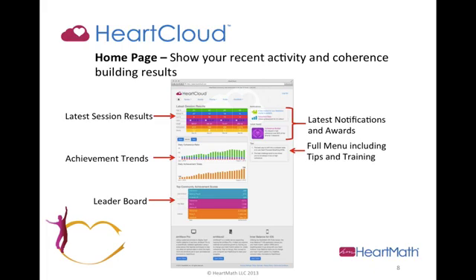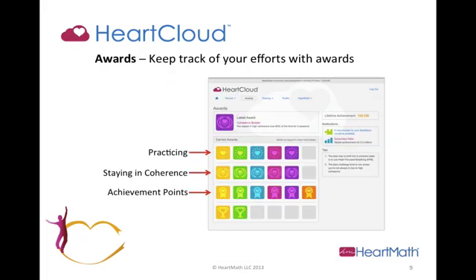On the Heart Cloud homepage, you can see your latest session results and achievement trends over time, and also who's getting the best score out in the whole system, and alerts on notifications and awards you've received, and other things of new training opportunities that you can take advantage of. And then on the awards page, you get the awards for the number of sessions done per day, per week, how well you can stay in coherence, and the total points you've achieved on all your stored sessions.